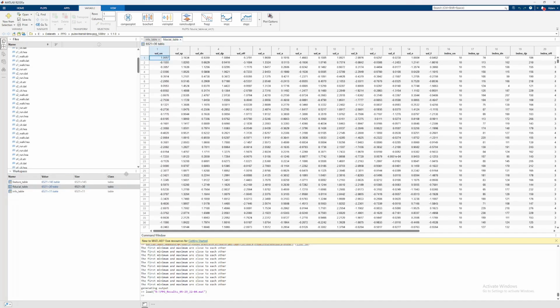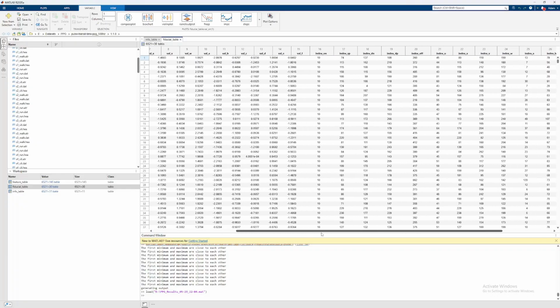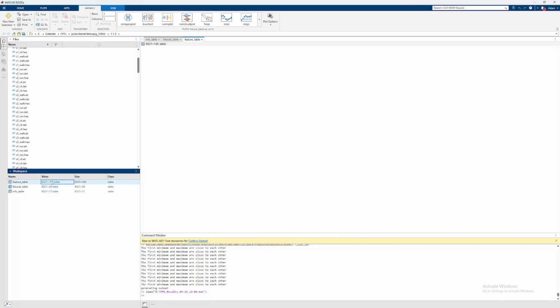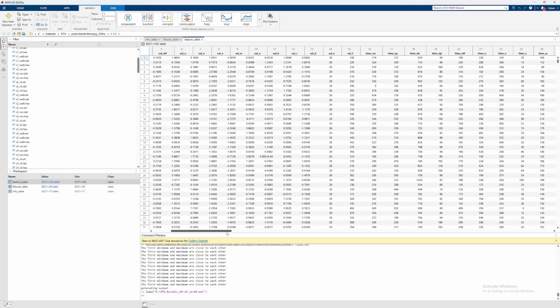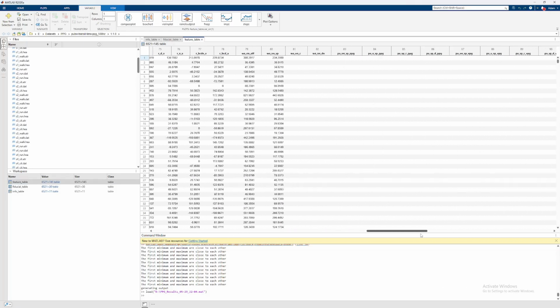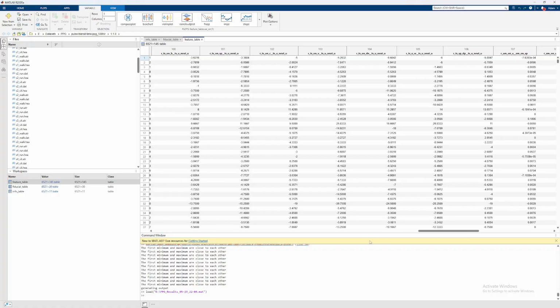The fiducial table shows all the magnitudes and time values for every fiducial point it calculated. And the feature table has everything in one table, both the fiducial points and all of the extra features. So if you extracted the data as CSV files, these would each be a single CSV file each.